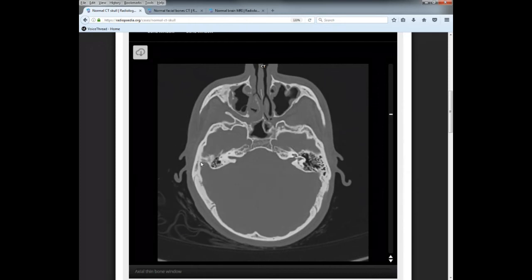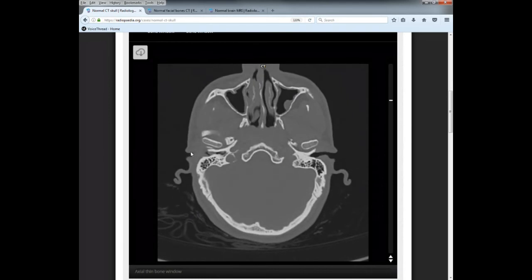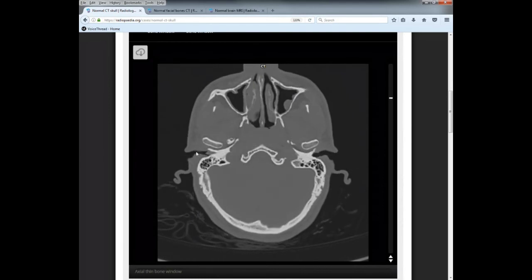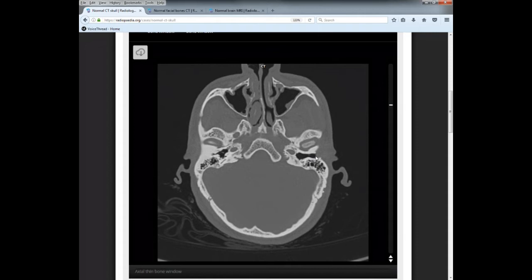What else? What are the other ones? So those ones you have to highlight: foramen magnum, foramen ovale, jugular foramen, optic canal, and then the EAM, pretty easy. Mastoid air cells, just anterior to the mastoid air cells, you have this air coming in, that's your EAM. Okay, right there. On this side, just anterior to the mastoid air cells, EAM, right there.